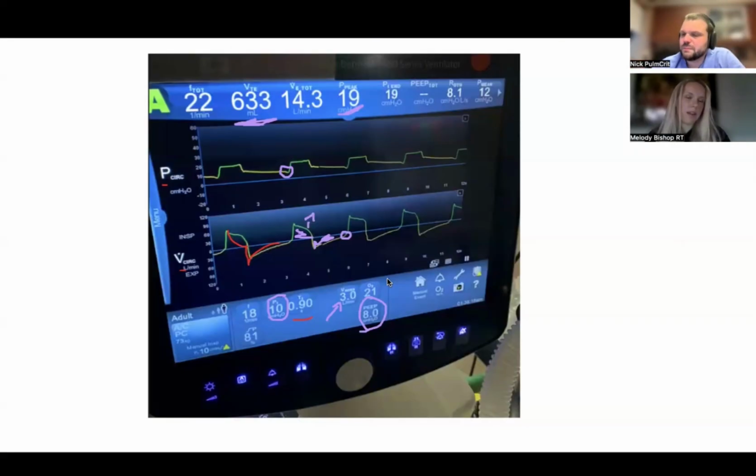I hear what you're saying, and it's true. I usually try to separate spontaneous efforts in my mind, even as a clinician, but I get what you're saying. So I think that number one, it isn't natural decay, so the patient is involved for better or for worse. Number two is that there's probably auto peep. Number three, I think there is some degree of work and work shifting.